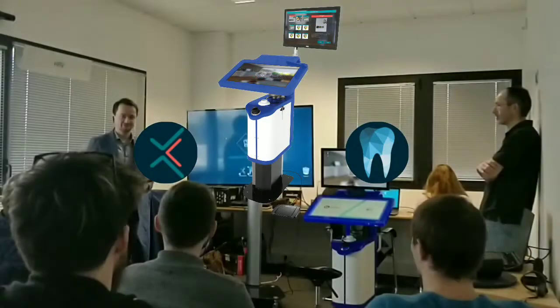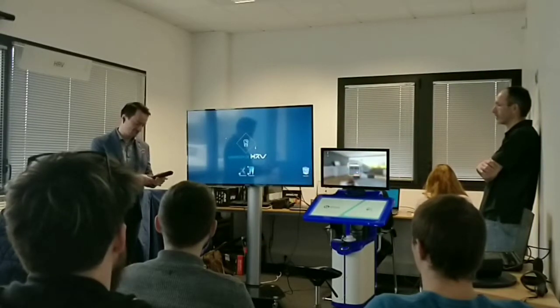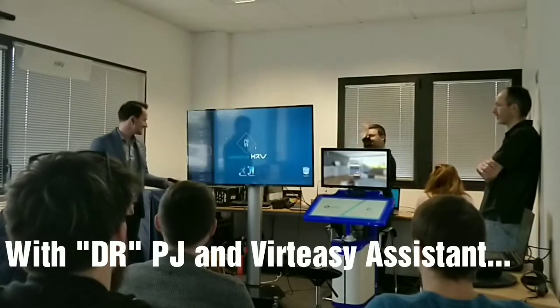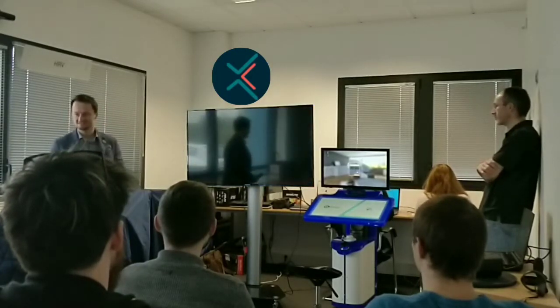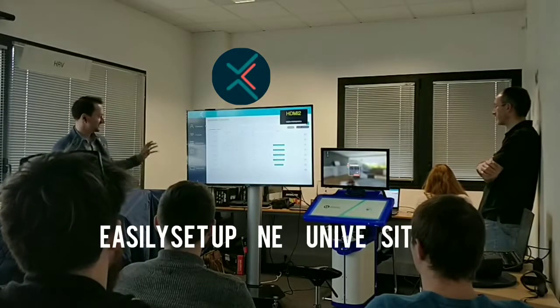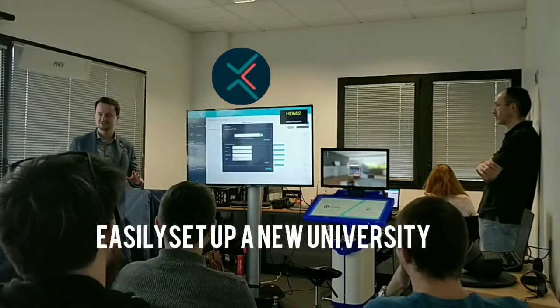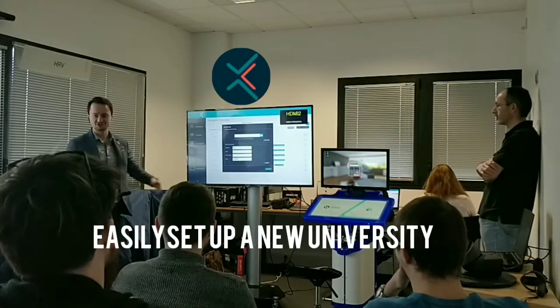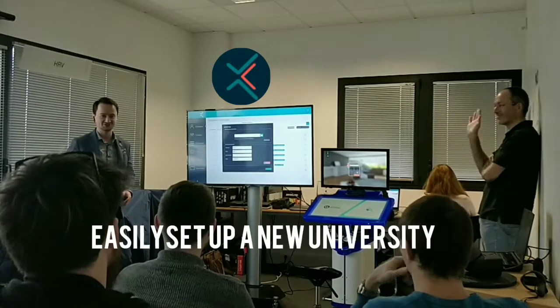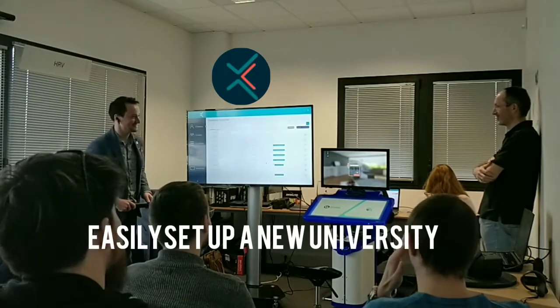Welcome to Virteasy University, where we have Dr. PJ that's going to set up a new university. So we have admin login for Virteasy Assistant, super easy to create new students. So here we have Tony Stark being created as our first student at the university, played by the amazing Anthony in the corner there.